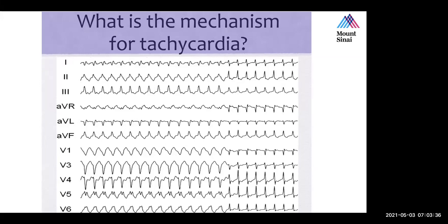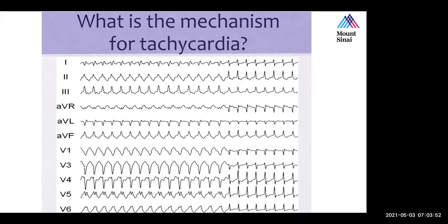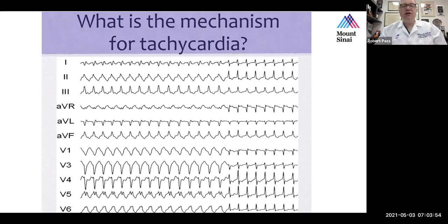And so I think, based on that, and the rate, do we know the rate? Let's say, since there's no boxes, let's say the rate is 210 beats per minute. So on the right-hand side, it's 215. On the left-hand side, it's 212. Okay.